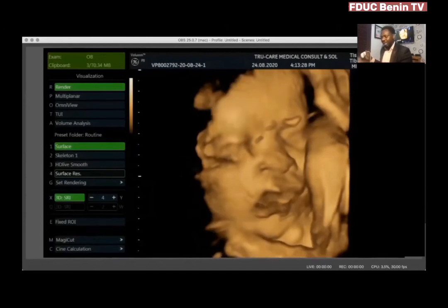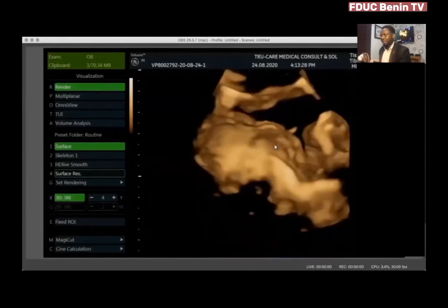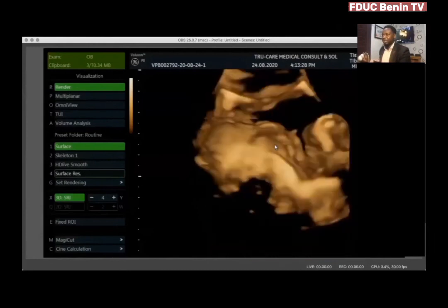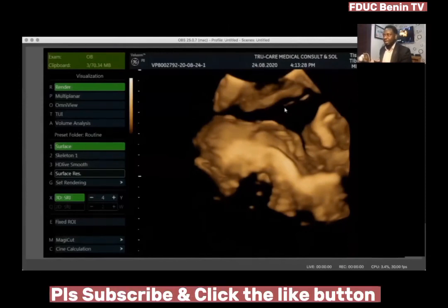Now, let's assume someone asks a question that I don't like these things that I hear. What can I do? This machine, for example, you are able to, like I rotate, I go along different axes. So you see, as I rotate along the x-axis, I can see that whatever is here is actually not part of the face, it is like an artifact.